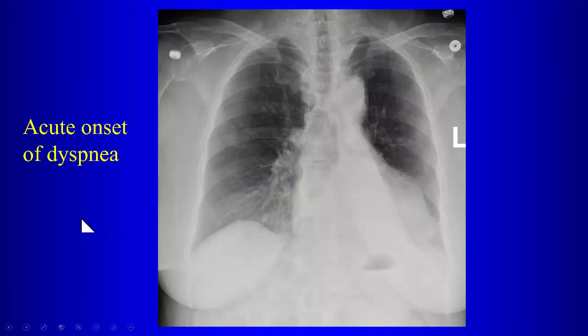Okay. Another patient with acute onset of shortness of breath. So here you're thinking about a left lower lobe atelectasis. Why are you thinking left lower lobe atelectasis? Okay, so a couple things. We see the heart border, and then there's a retrocardiac opacity, right? But what else about the opacity? It obscures what? The diaphragm. It obscures the left diaphragm.